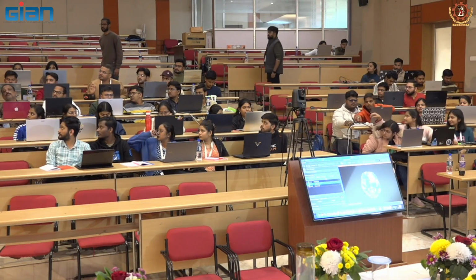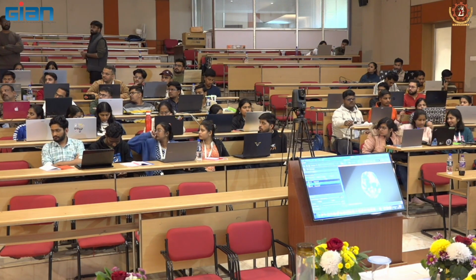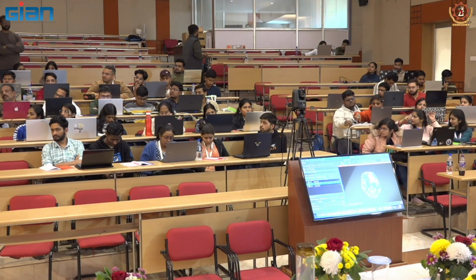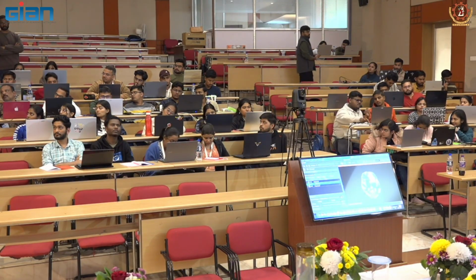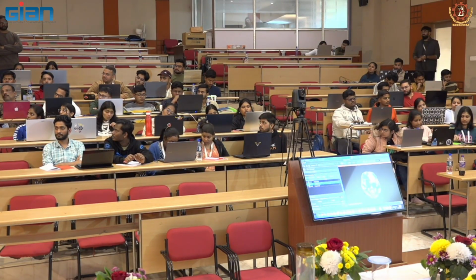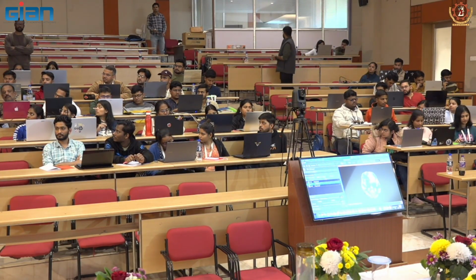These four protocols that you see, T1 pre-contrast, post-contrast, T2, and FLAIR, are the structural protocol sequences. There are other functional sequences, for example fMRI, functional MRI, and you have PET scan. These three rather, T1, T2, FLAIR, are typically available in all machines. So any place you have an MRI scanner, you will be able to get these. For the more specialized scans, you need other kinds of machines.